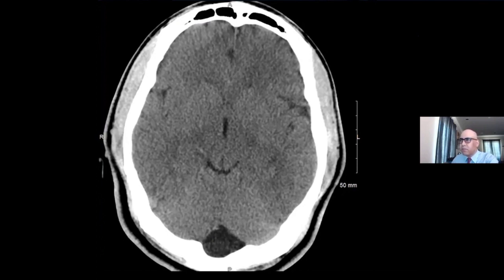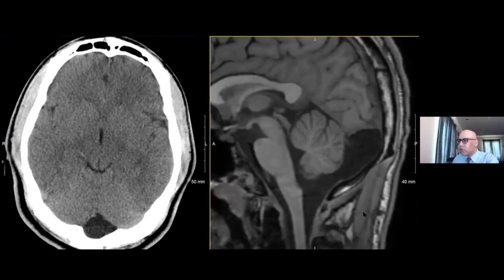being performed. An MRI of the brain was performed and shows a normal development of the cerebellar vermis. We see the superior medullary velum, the inferior medullary velum. The little angle where they come together is called the fastigium. And there's a normal fastigial angle. Overall, the cerebellar vermis looks on this mid-sagittal image like the video game character Pac-Man, directed towards the brainstem. So the cerebellar vermis is normal.